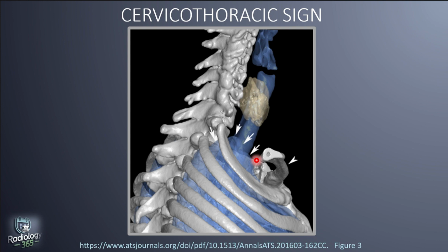Also, I understand the term cervicothoracic, calling it negative or positive, in the sense that cervicothoracic means moving from cervical region into the thorax. Based on the anatomy, it's easier for structures to move from the neck down into the thorax because there's no resistance, and because of the retrosternal space, it's just a space, so it's very easy to just move down into the space.